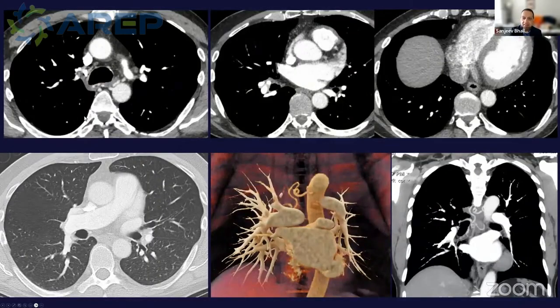In chronic PE, you'll notice that we've got these very big bronchial arteries. The mosaic attenuation here is not so profound, but you can really appreciate the big bronchial arteries, right ventricular enlargement, right ventricular hypertrophy. Here is the web-like defect there. This was a patient who had chronic pulmonary hypertension as well. Let's switch gears and show just one other example.